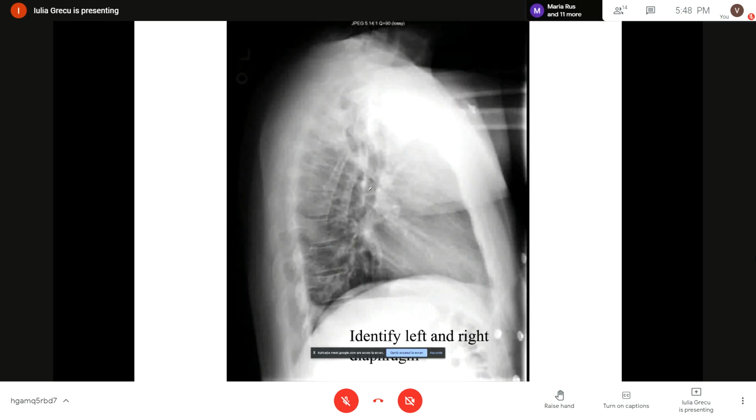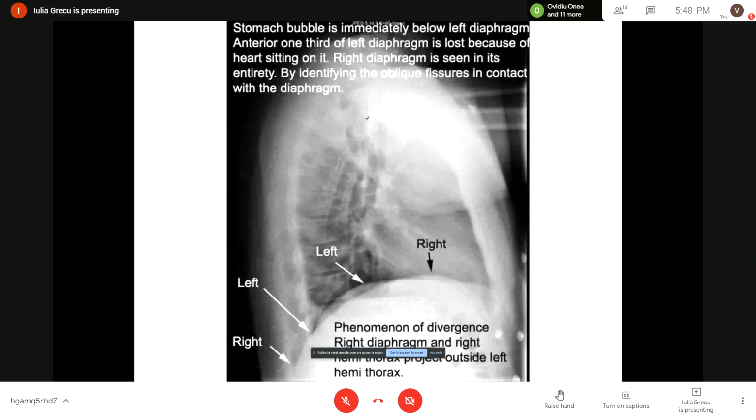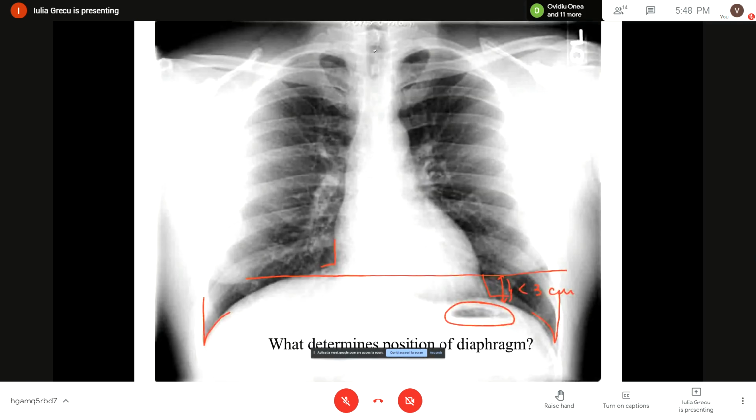This is something you have to keep in mind and remember, because we will discuss it further along in a few minutes. So getting even deeper in the chest X-ray, we will start to analyze the trachea and bronchi.